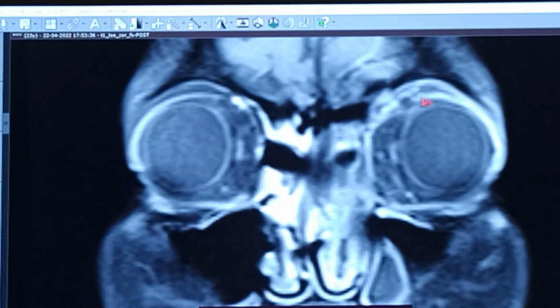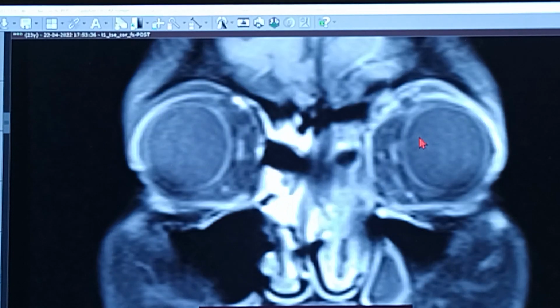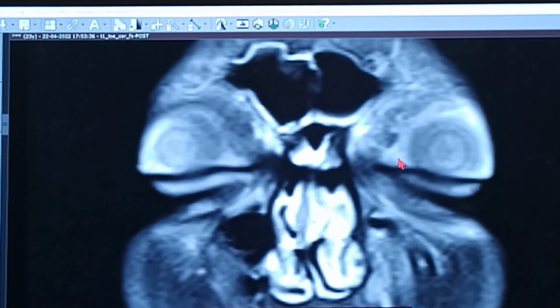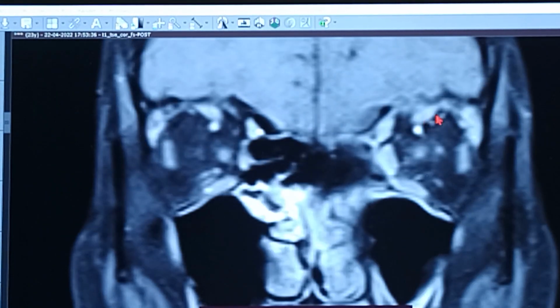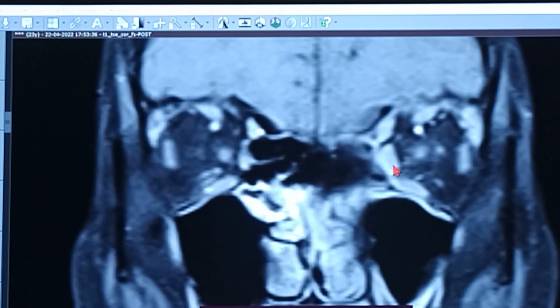You can actually see the muscle over here. I think this is supposed to be the LPS. That has to be the LPS somewhere around, not clearly seen, but this should be LPS somewhere. The entire upper eyelid elevation is supplied by the LPS, and the superior division supplies the LPS and the superior rectus. So the superior rectus and the muscle above it, the LPS, are supplied by the superior division of the third cranial nerve, and the medial rectus and the inferior rectus are supplied by the inferior division of the oculomotor nerve.